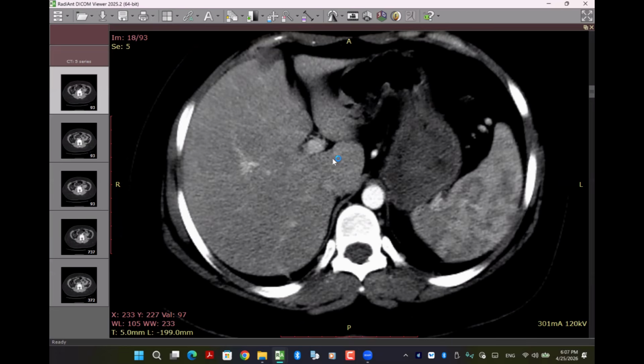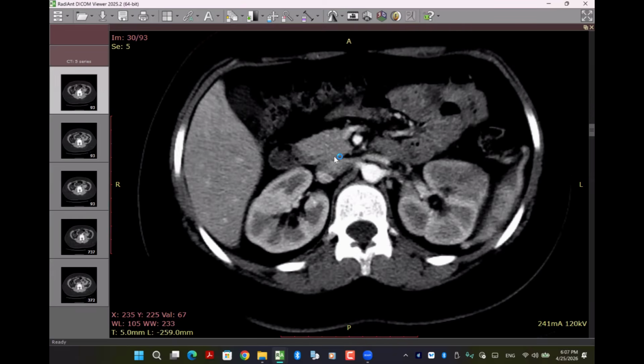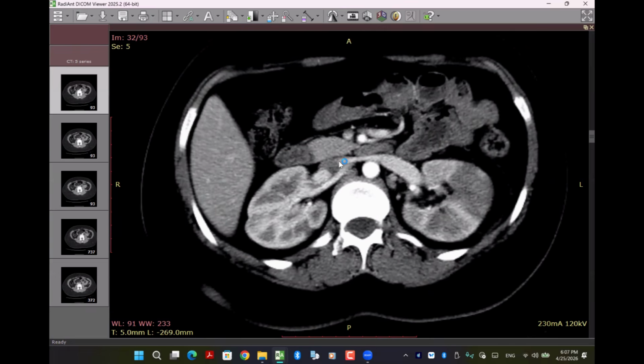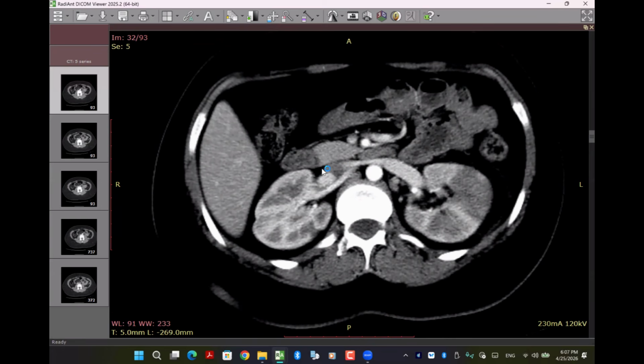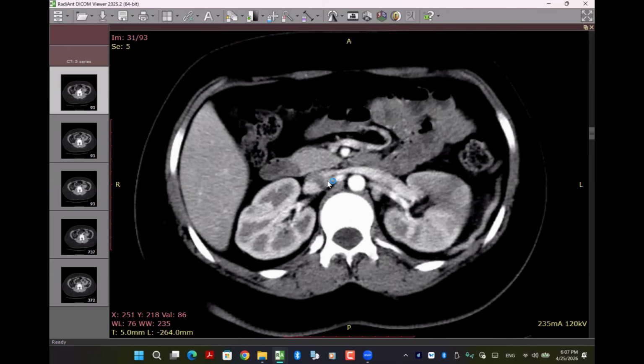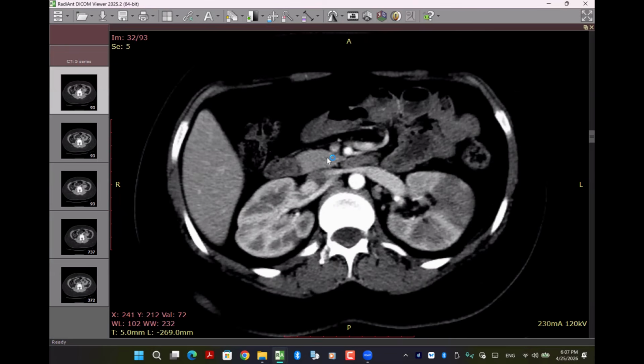Okay, no problem. I'm presented with CT scan axial sections, post-contrast in arterial phase images. And here I can see that there are patchy areas of... If you please, can I stop you for 1 second? Don't state, if you are talking inside the genitourinary, don't say it is arterial phase. Okay, so what is this phase? Corticomedullary phase. Okay, you can go.